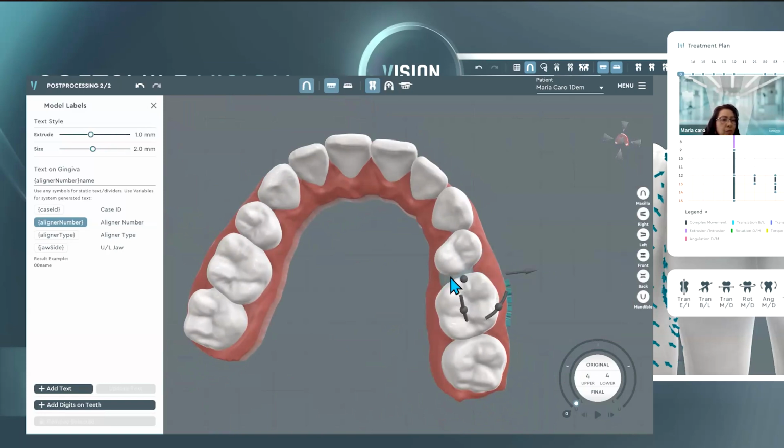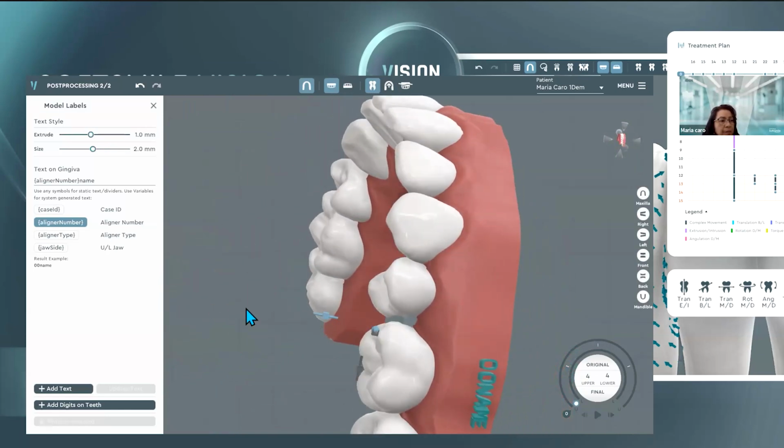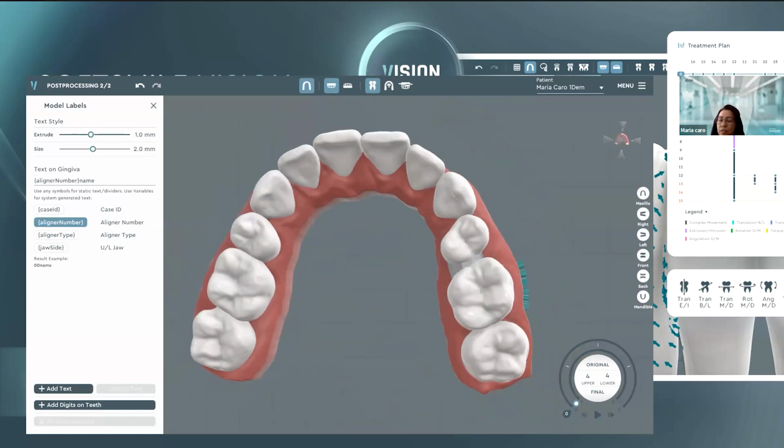So then we can simply just right click and go back to the scale. And then you can see that the gizmo now changes. So we can manipulate the scale manually with the gizmo. So these are some of the new settings that you have available in this version 1.13.